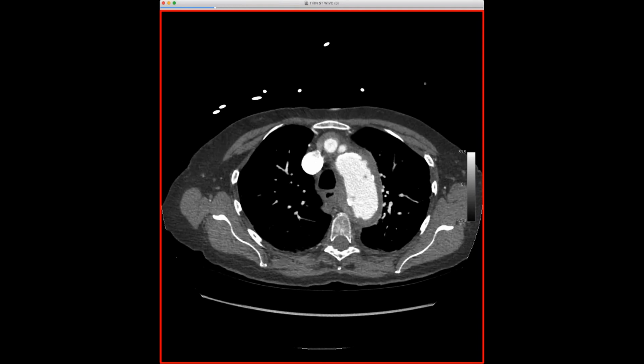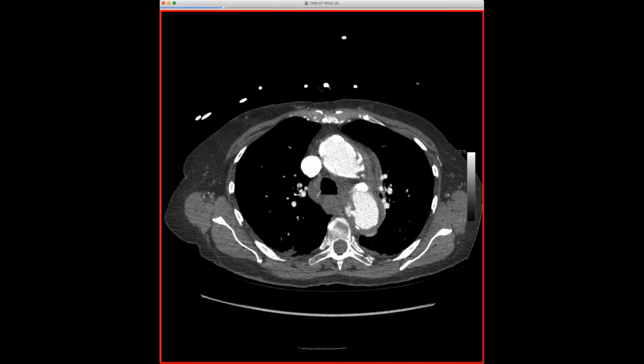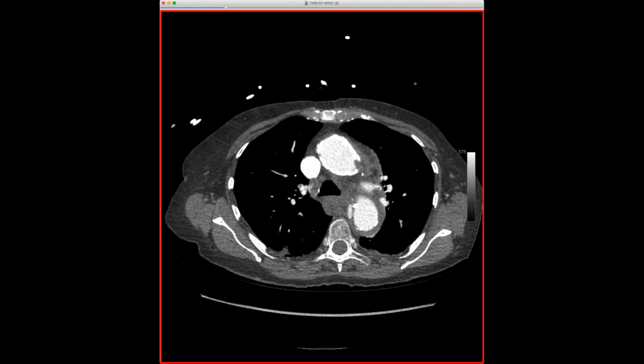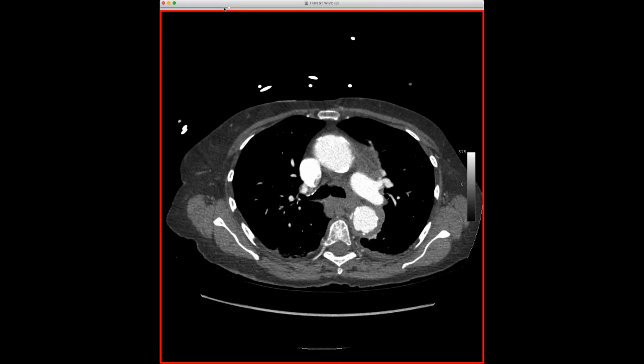And the elongation of this abnormality, the fact that you've got a second channel that goes for centimeter after centimeter like this, for a foot here, is really an indication that this is a very extensive lesion, and that argues against penetrating ulcer, which tends to stay localized. So I think this is really a type B or maybe even a type A dissection. I don't quite know where it started. But I think the elongation of this thing is really a strong argument for dissection and against penetrating ulcer.